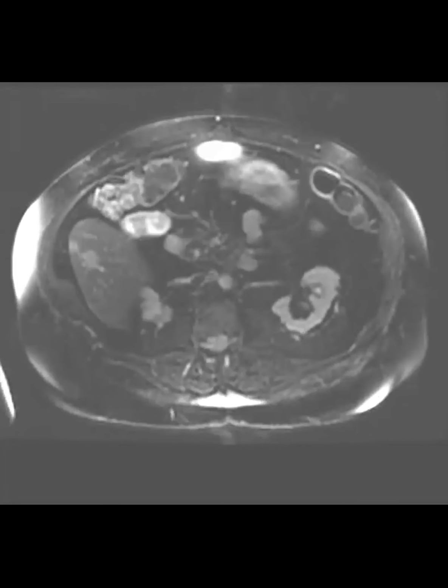And in terms of PET, I looked, again, let me pull it up. I'm going to move away because once I change the display, it may show sometimes.